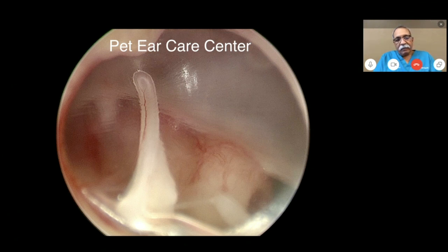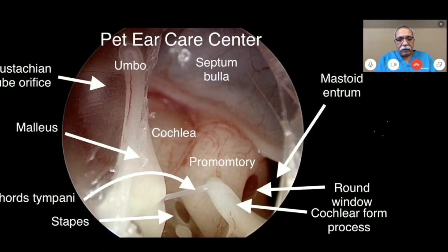We are going to be talking about the ears, and I'm going to start with the endoscopic view of the tympanum, because anatomy is extremely important. Ear is a very complex organ. There is so much anatomy that makes it very confusing. So the more we know about anatomy, the better it is. So this is a view of transtympanic middle ear structure. On the next one, these are all after removing the tympanum. These are all the anatomical structures you see. Getting more used to this kind of structure will make you read the CT much better.